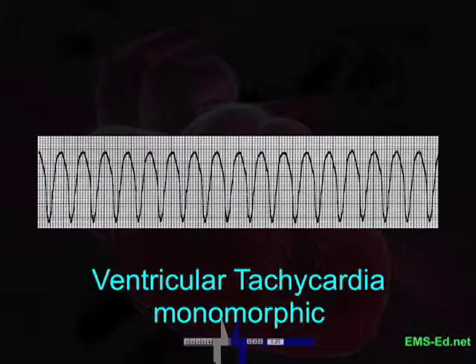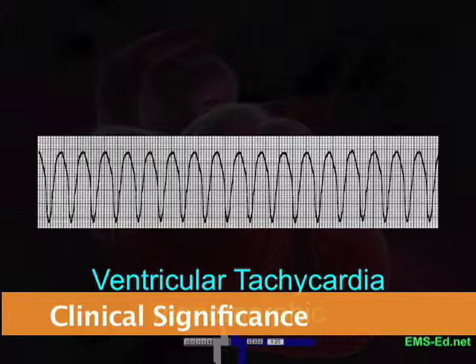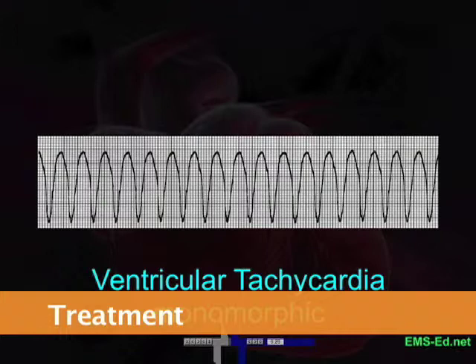So they're one shape. Causes for this EKG include myocardial ischemia, increased sympathetic tone, hypoxia, idiopathic causes, acid-base disturbances, or electrolyte imbalances. The result is decreased cardiac output, possibly to life-threatening levels. Worse, it may deteriorate into VFib. Treatment in perfusing patients include IV, O2, and consider immediate cardioversion. We may consider lidocaine or amiodarone. Non-perfusing rhythms we should treat just exactly as we would ventricular fibrillation.